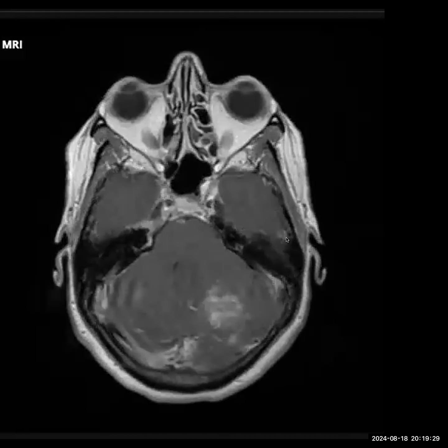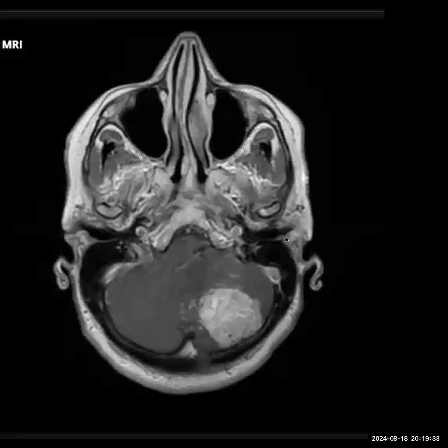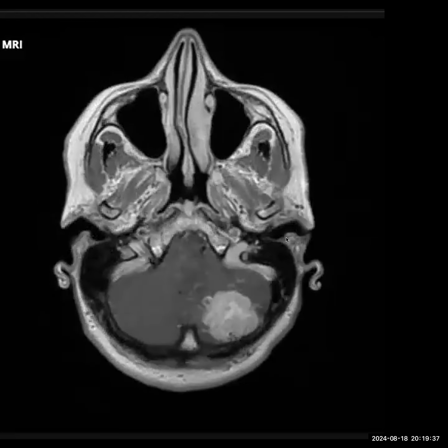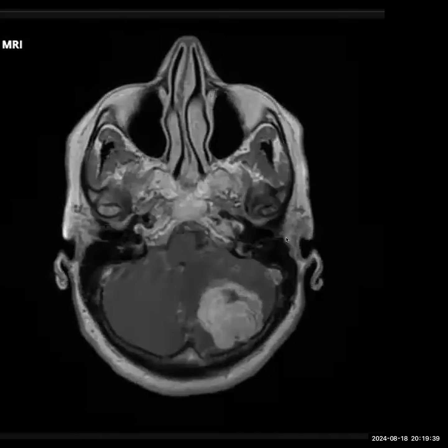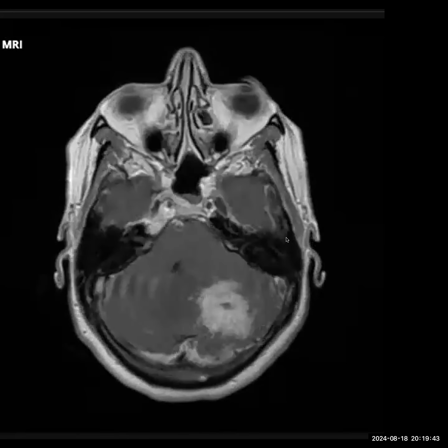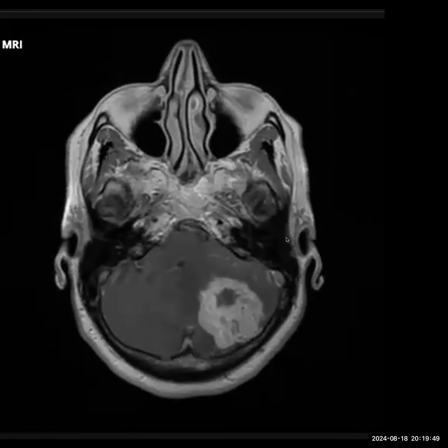Thank you. If I were to tell you that this patient had an incidental swelling in the testis, and that an ultrasound was done and it was completely benign, would that make you think of any other differential? Testis ultrasound was benign. Yeah, there was a lesion in the testis, but it was benign.